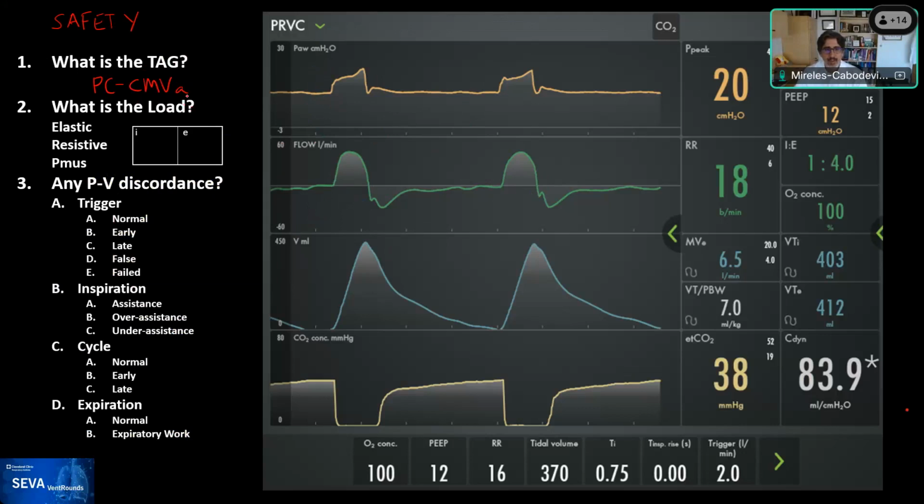And then it says adaptive, and frankly, just by looking at this waveform, it would be impossible for us to say whether this is adaptive or not by looking at the waveforms.